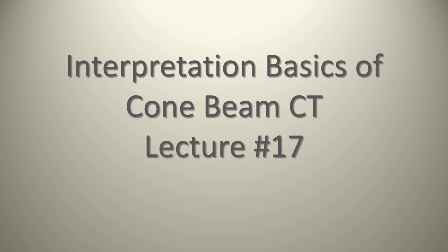Lecture 17, Interpretation Basics of Cone Beam CT. So, when we looked at things like cone beam CT, there's a lot of practitioners out there that think that cone beam CT is the be-all and end-all, and that we should be taking cone beam CTs of every patient before we work on them, after we work on them from an implant perspective, on 5-year-olds to diagnose pathology.